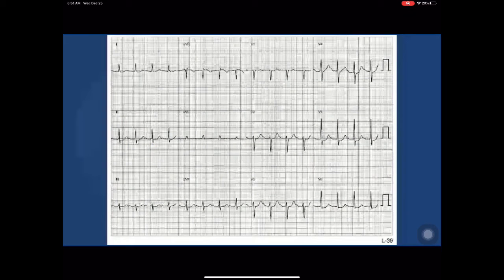Okay, so you've had time to think about this. What you have to realize is there is a little P wave, very narrow, right here, equidistant between the 2 QRS complexes. Okay? So that is an ECG observation, you can see it here too, that you simply need to know. And I'll show you the intracardiacs in a moment. Not only is it here in the middle, it's narrow. So I want you to think about, how do you get a narrow P wave?